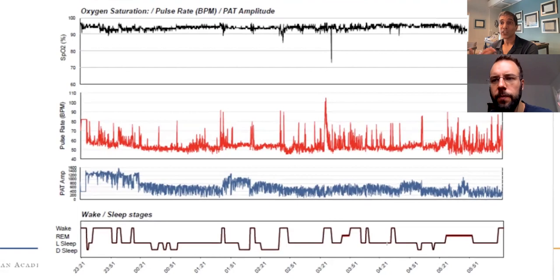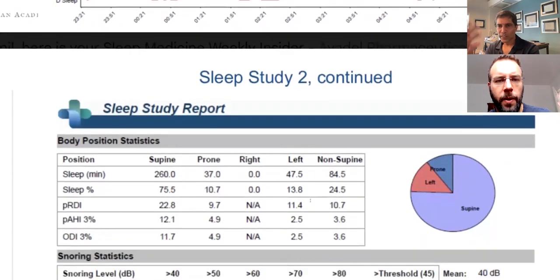Those were substantial enough that they knocked you out of those stages, and that's not ideal because your body wants deep sleep. It wants REM sleep. It wants deep sleep for feeling vivacious, alert, giving that restorative sleep. It wants REM sleep for processing memories, information, and learning. Anyway, onwards, right? Because we're only on number 2, Andrew. Okay, and we may not even get through all 10.